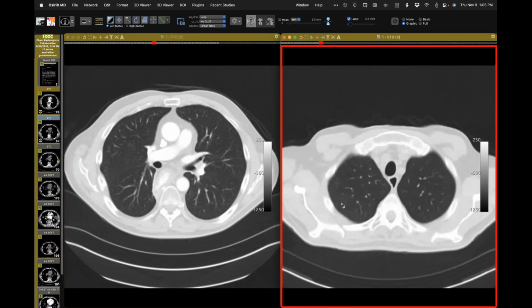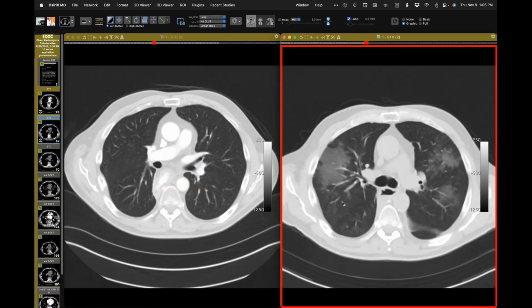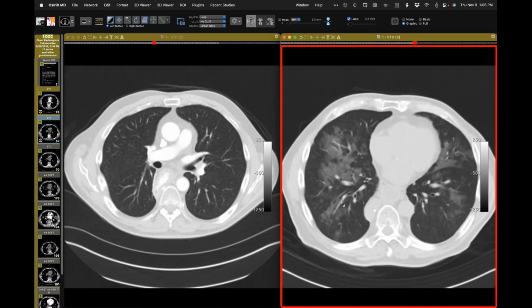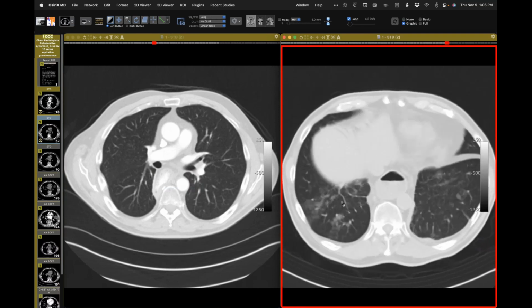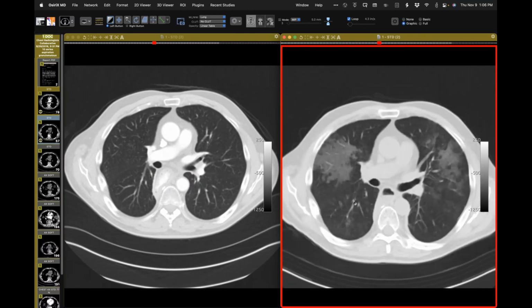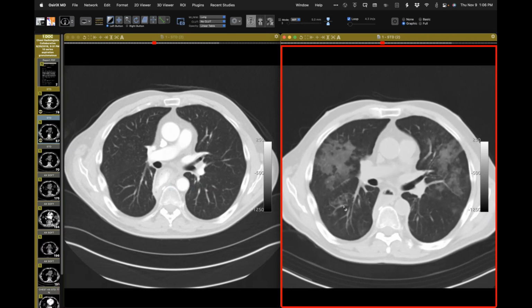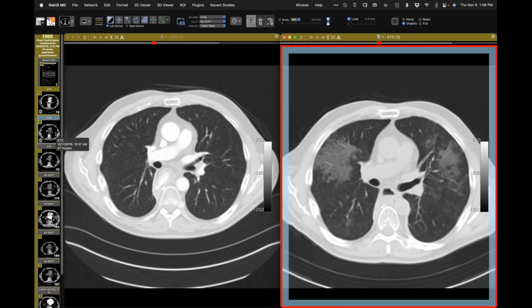Back in 2018, we have very extensive ground glass attenuating opacities, central lungs, mostly in the upper lobes, but also the lower lobes, consistent with consolidated lung. And I think it's reasonable, since I don't have thin sections, that this may have been considered maybe a subtle case of crazy paving.